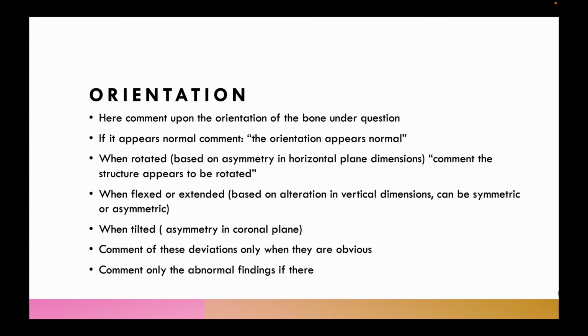Why? Because obturator foramen comes in the coronal plane, or it lies parallel to the frontal plane. That's why it is more prominent when the pelvis is flexed. And if it appears to be smaller, that means obturator foramen is going more orthogonal to the frontal plane, and therefore its vertical extent will appear smaller.